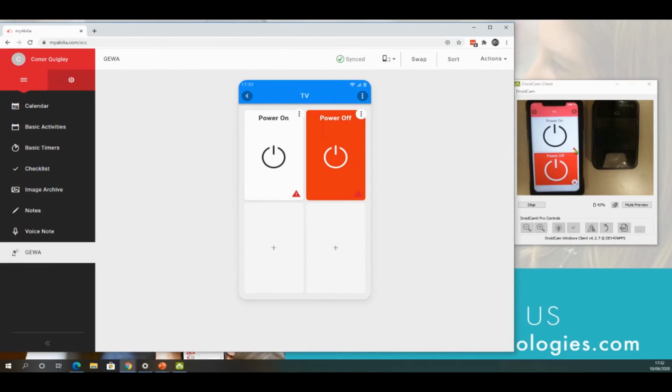They will also get the red icon, so when they press on that, they can choose between recording the IR using a Gewa link. We're recording, they just put their power button. They're pressing the power button once. It'll ask them to press it a second time. So it's a 3-step process. So we'll press it a second time.